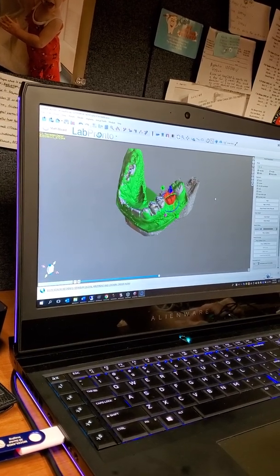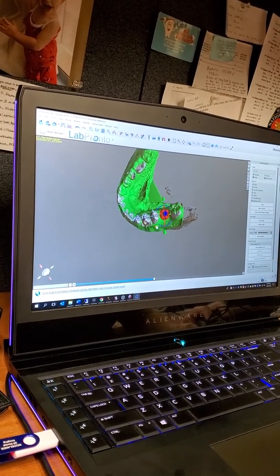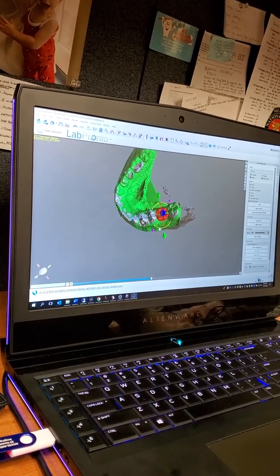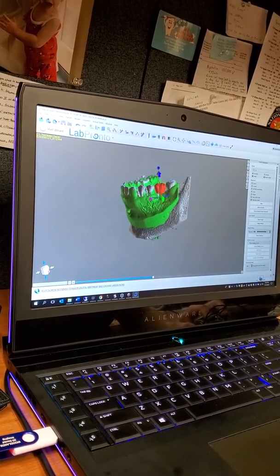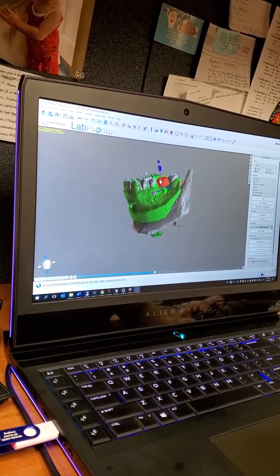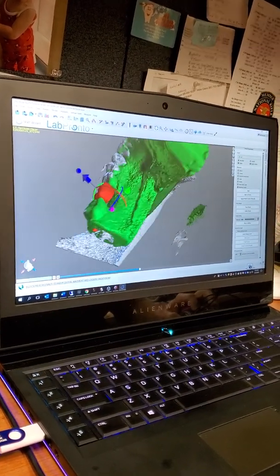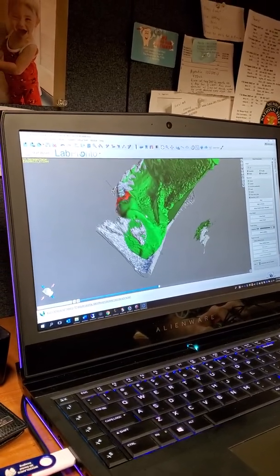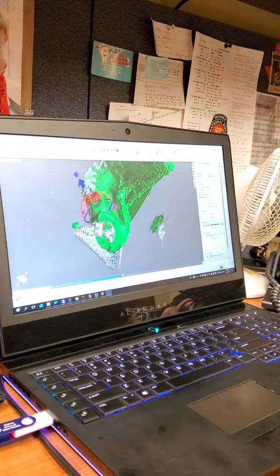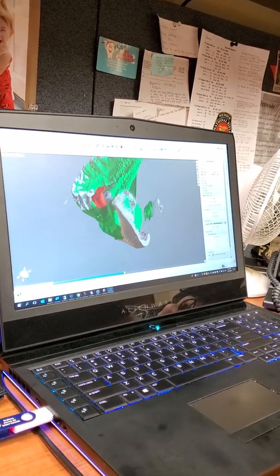So you can drag it where you want it. So from the occlusal, I'm going to drag it here. I'm going to make it wide enough so it fits in there perfect. Rotate it just like I'm designing a real crown. I'm going to do it this way. So I'm trying to make it as accurate as I can quickly to be at the perfect spot. So I'm going to drag it there, make sure the central fossas line up, like so. So I like that pretty much.